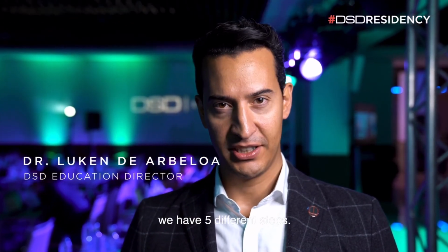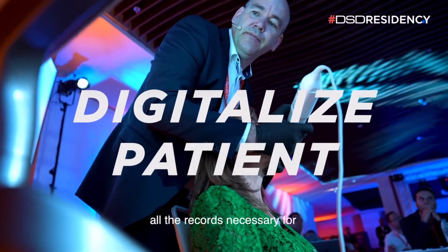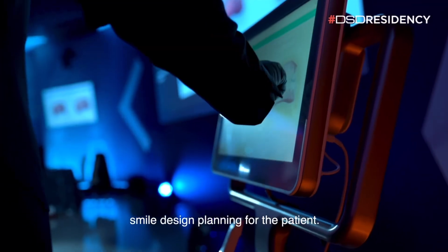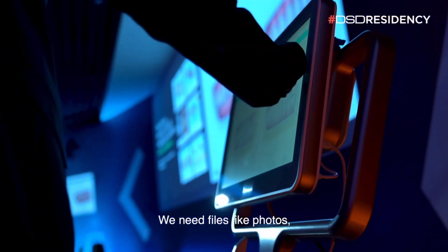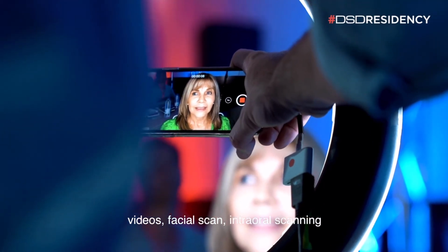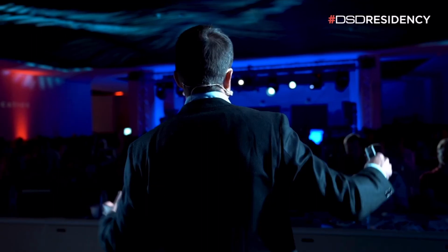In the DSD methodology, we have 5 different steps. The first one is the patient digitalization. It's the step where we want to take all the records necessary to create the perfect, ideal smile design plan for the patient. We need files like photos, videos, facial scan, intraoral scanning, and all the information that we think is necessary to start to plan our case.